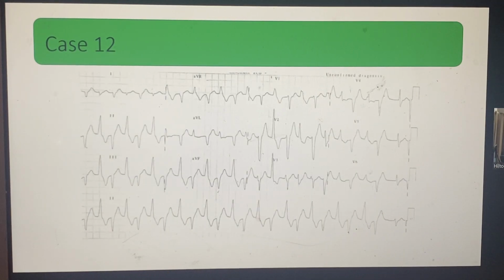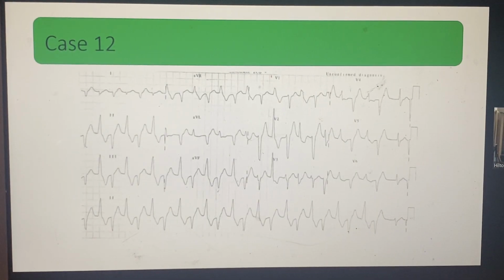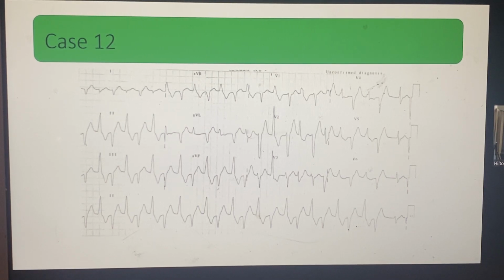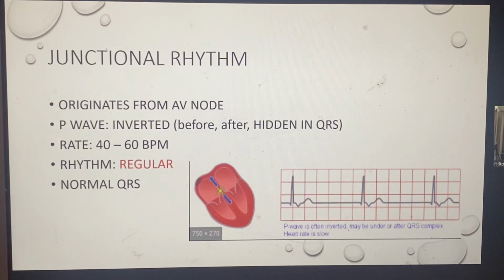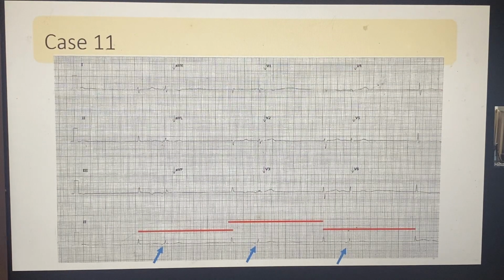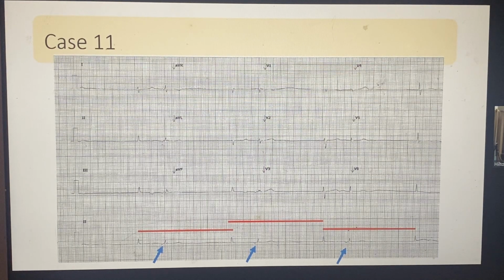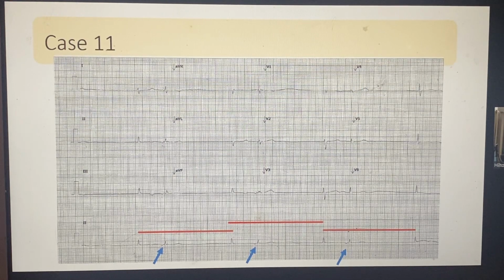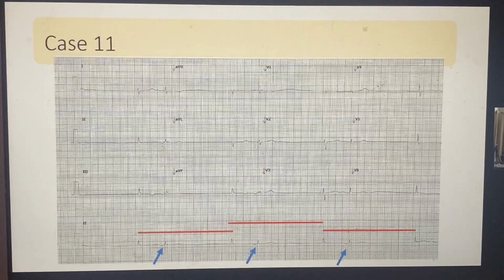Okay, maybe on this part, would anyone like to add? Actually, I just want to ask Ridwan, would you consider a differential of a junctional rhythm with an atrial echo? That means the impulse from the junction goes up the slow pathway, gives a retrograde A, and comes back down the fast pathway for one beat, leaving the QRS. But of course, it's not in the answer, just an open discussion.